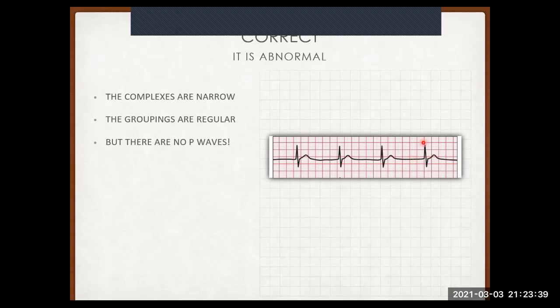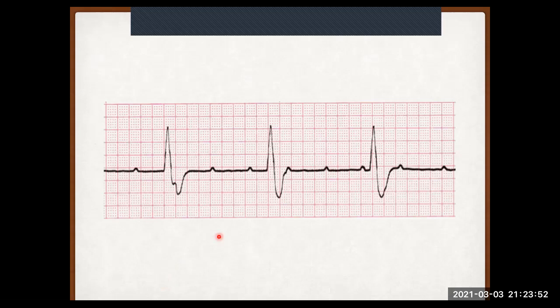I mean, this is a very technical ECG rhythm strip actually. And if you don't know the diagnosis, nobody will fight with you about it, but at least you knew it was abnormal, and that's the most important thing. Let's go to another one. All right. So again, if you want to challenge yourself, I'm going to keep quiet for a little while.